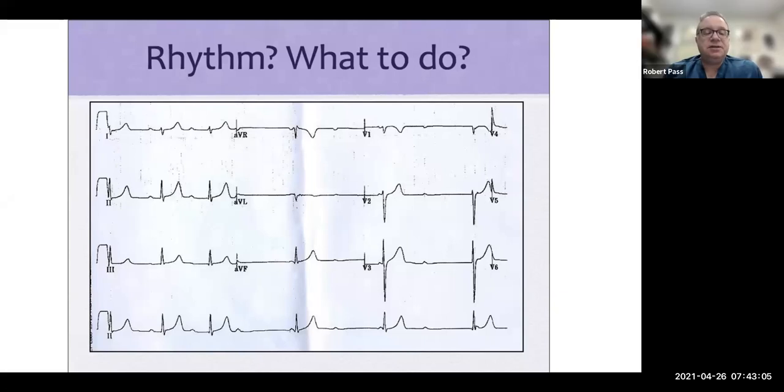So let me interject. Yes, you can see this from inflammation, but this is absolutely not something you'd ever want to see. Yes, it's true that you could see this after an ablation, and yes, it could be from inflammation, but you would never consider this a normal or usual finding following an ablation. This is a bad thing to see. It suggests that there has been injury to the AV node as a result of the ablation. And so, we would not send someone home like this because we would be concerned that it would even progress farther. We would not have left the lab.